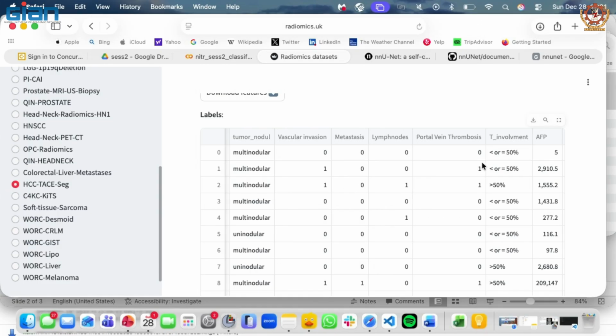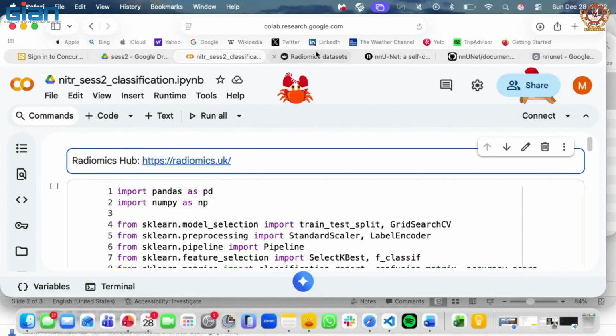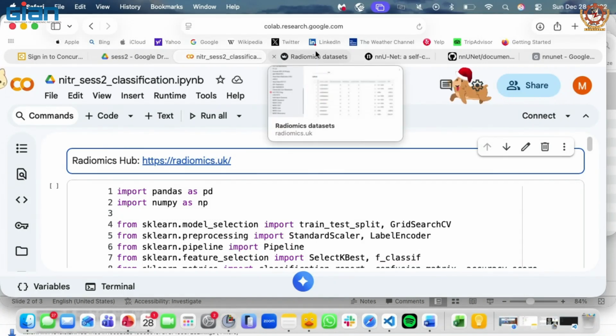So the PyRadiomics tutorial that I gave you yesterday, you don't need that anymore. But still, if you get your own data, you still need to run PyRadiomics, and I hope it was very easy, just a few lines. But if you want to work on some public datasets, just save your time, take the radiomic features from here and run your classification model. Now, how to run your classification model? Yes. Sorry, any question? No?